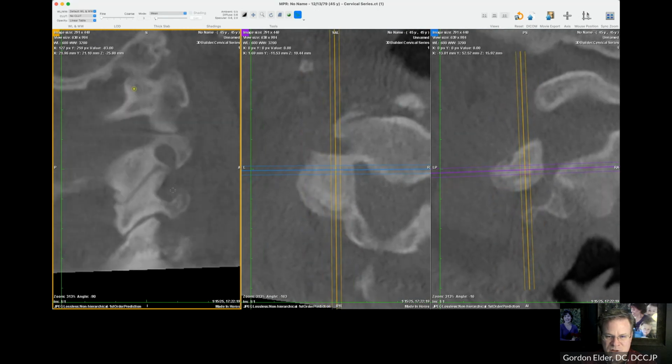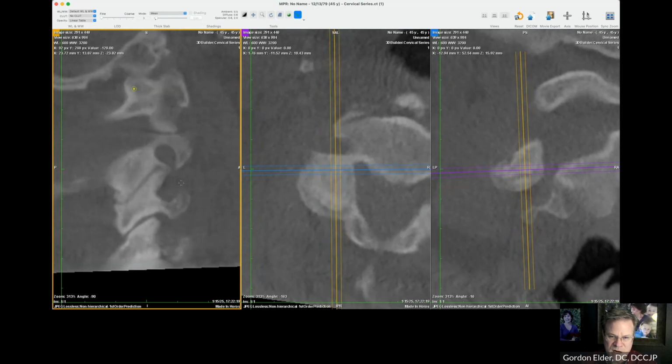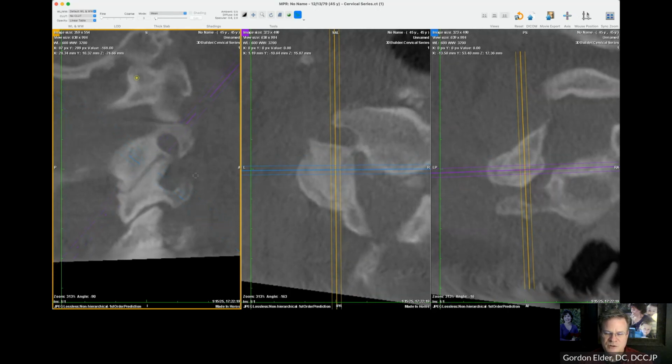We had the anterior wedge, which isn't showing up real clear on this picture now, that would seem to indicate it had gone posterior. So we're getting conflicting, not a clear answer. So typically I'll leave those alone, unless in my exam I'm pretty sure that it's misaligned, and then I'll maybe come back and look at this again or determine from the exam.